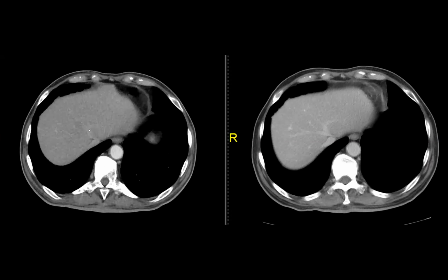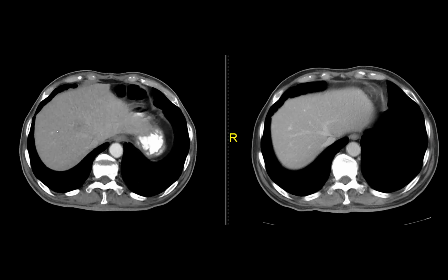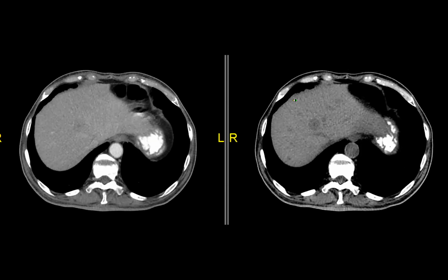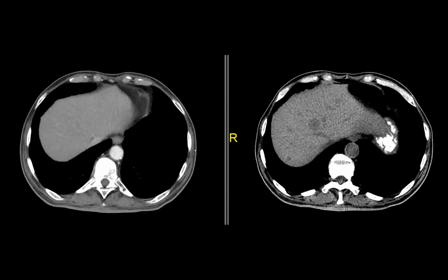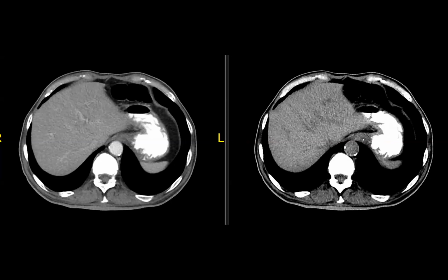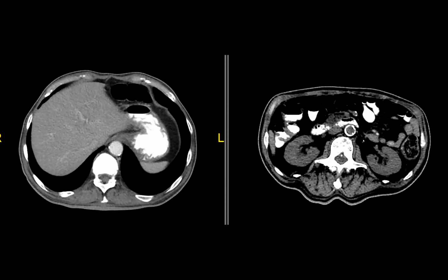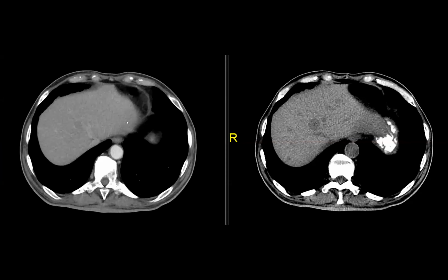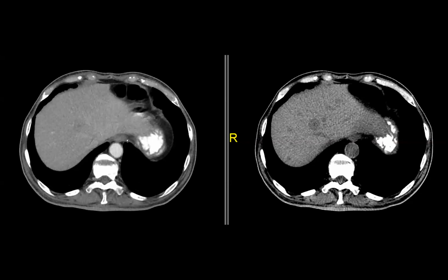But this can be easily dismissed as just fat. The thing is that this study also includes the pre-contrast. And when you go to the pre-contrast, it is much more convincing that this is a true lesion. And you can see there's another one here. So this is just an interesting example where a non-contrast was more helpful for metastases than post-contrast. So anyway, that was an interesting case.